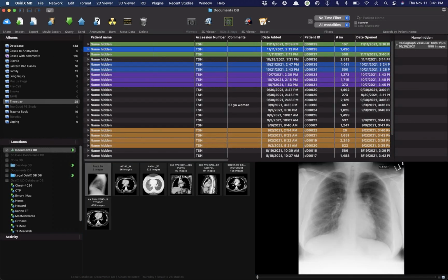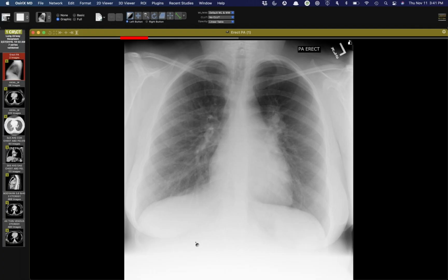So that's the theory. All right, and then this radiograph is kind of fun and ties together a lot of observations that have been made throughout this hour, both Howard and David. In this case, you can see that there's asymmetric enlargement of the left hilum. Notice that there's a relative paucity of vessels throughout the left lung, leading to the left lung looking more lucent.